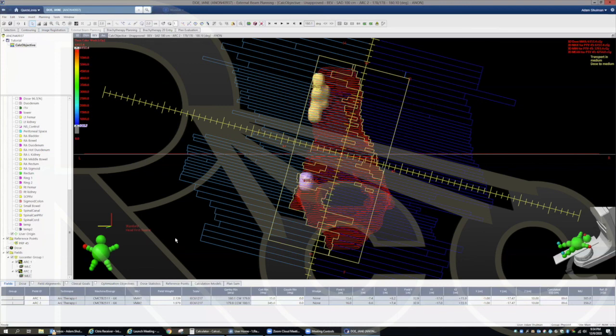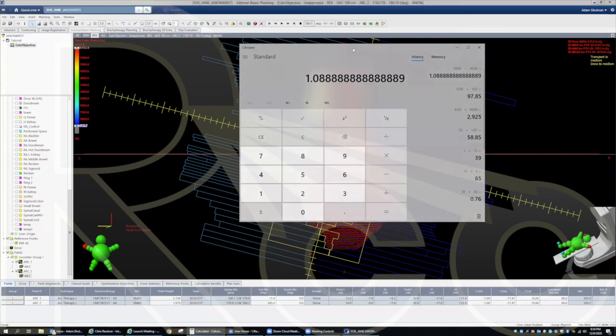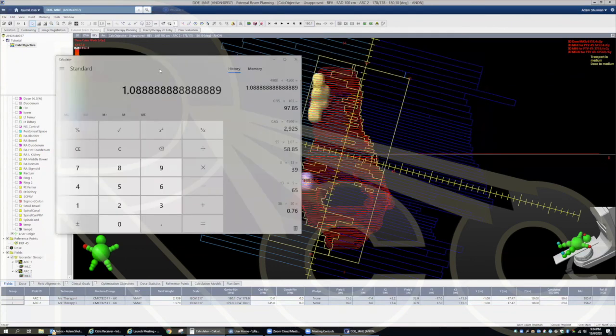So you add up the MUs and divide by the dose per fraction. Okay, so this would be 385 plus 356, divided by, I think you're just over 4. Dose per fraction divided by 1.8. 180 centigray, yeah. Well, okay. It's 4.